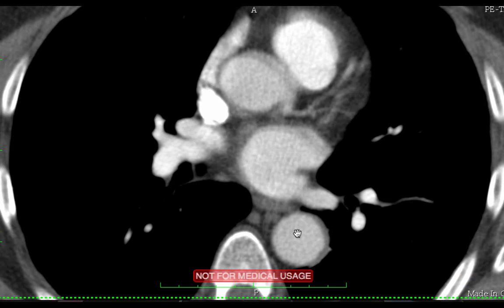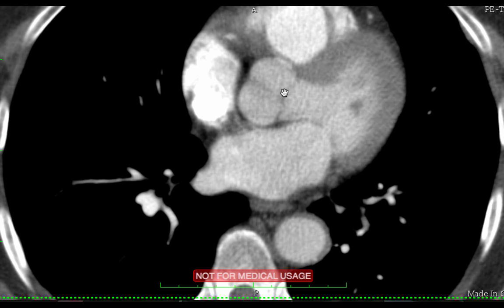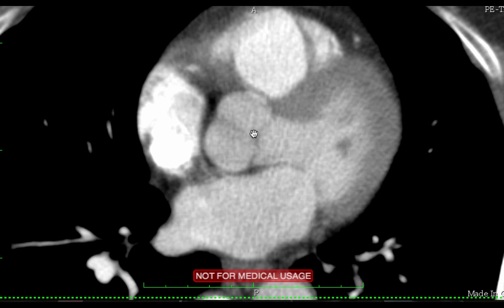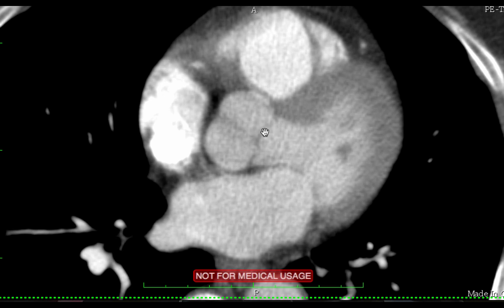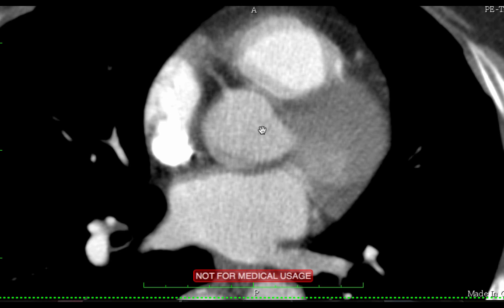And the ascending aorta begins right here at the aortic valve. And the aortic valve is a 3-leaflet valve. And one of the amazing things here is that, remember that the heart itself needs that oxygenated blood. So it has to get systemic blood to the myocardium of the heart, just like everywhere else in the body, with the exception of the lungs, of course.